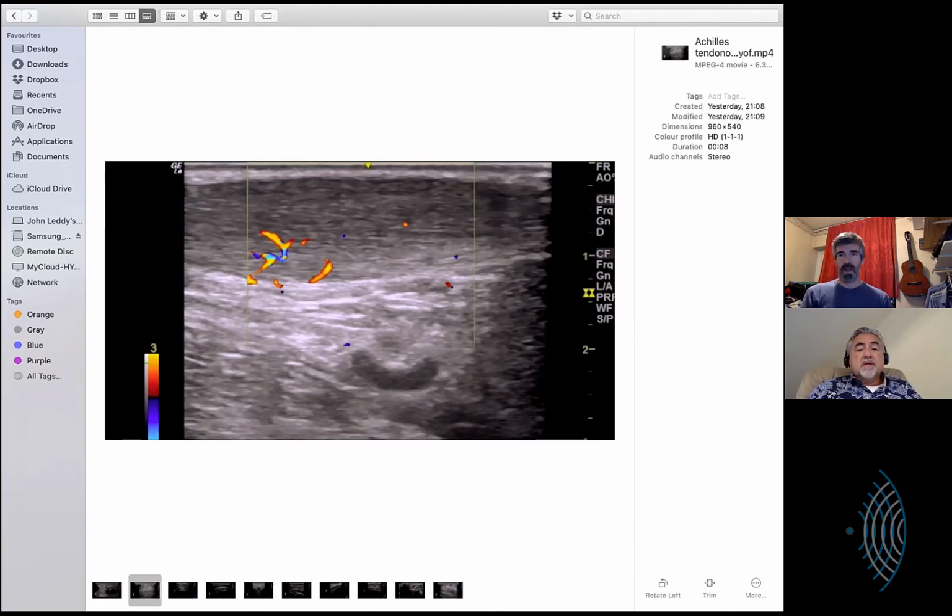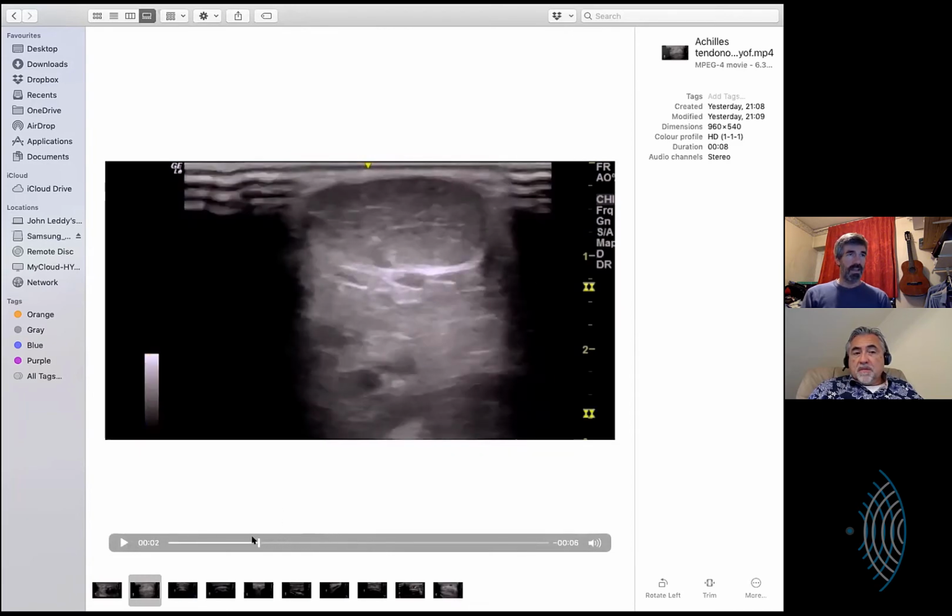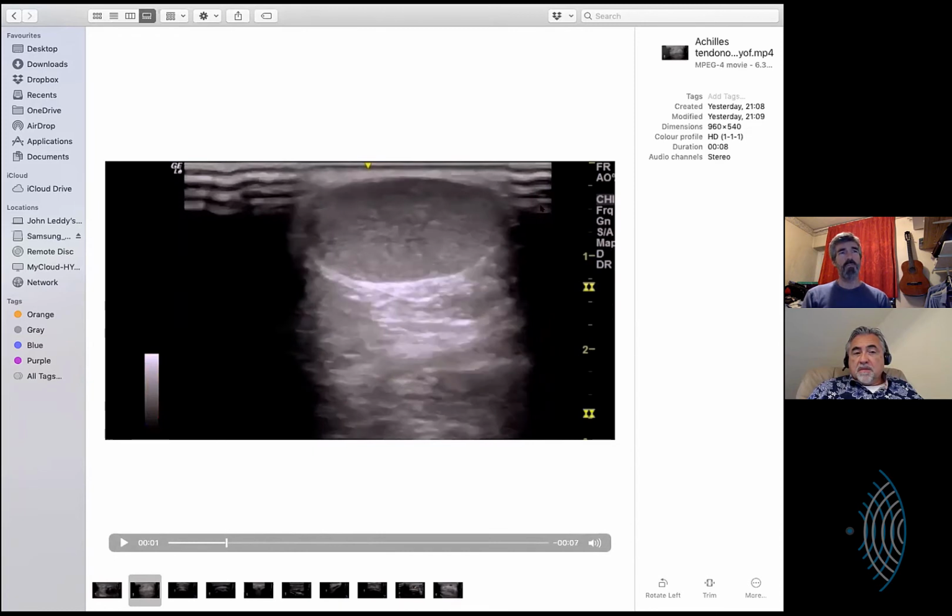I'm not sure, and again, I don't do a lot of longitudinal work, but I don't think these things ever become normal. I think they become better, and over time you do see changes associated with that. But I would expect this is big enough, and if you look in the short axis section, which I think was earlier on, it is quite thick and homogeneously thick.